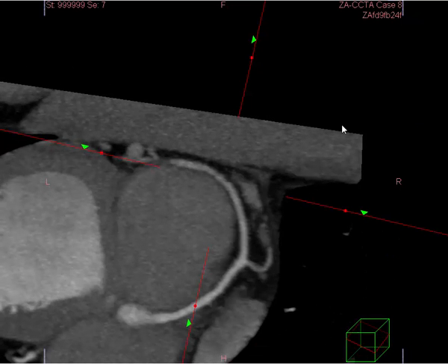So in summary, this 57-year-old man, in my opinion, has no evidence for obstructive disease, but he does have much more disease than you might anticipate. He has got the calcified non-obstructive disease in the LAD. He's got some non-calcified plaque involving the left main. It does not appear to be obstructive. He's also got mixed non-calcified and ulcerated plaque involving the ostium of the left circumflex, and there is probably some mild non-calcified plaque in the mid portion of the right coronary artery. This patient would need to be treated very aggressively with respect to traditional risk factors.